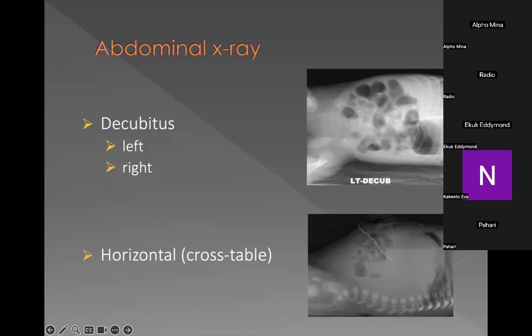How do you know it? Because on this X-ray, the spine, you can see it here, is positioned and visible through the mid part of the body, and we can see the spine with the AP view.